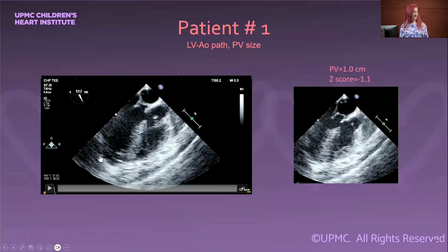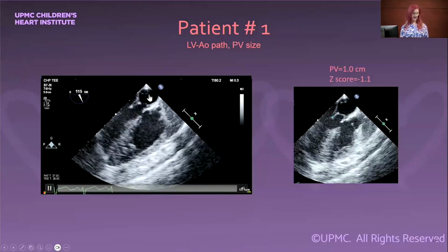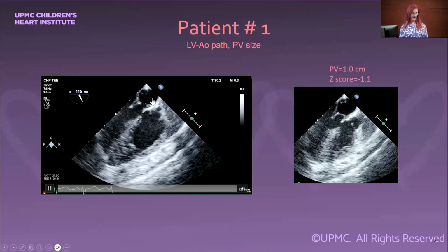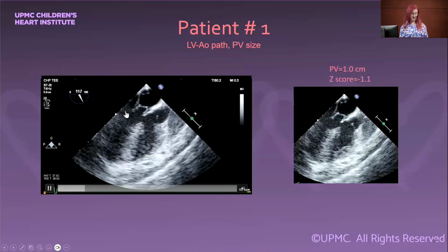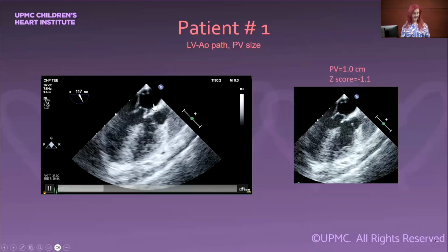It was easier for me to show on this particular patient, this is the pre-op TEE, how you would envision the LV to aortic pathway. For people who aren't familiar with TEE, this is the LA. Sorry, that's not the LA. Here's the LA, the mitral valve. Here is the pulmonary valve, which is in continuity with the mitral valve, transposition, dilated MPA, and the aortic valve.